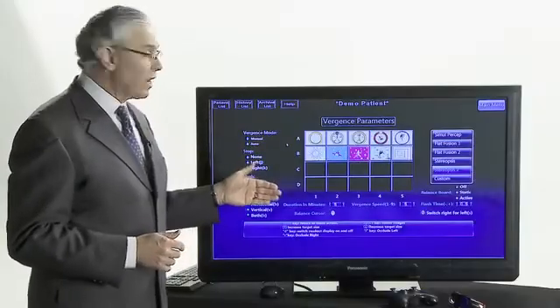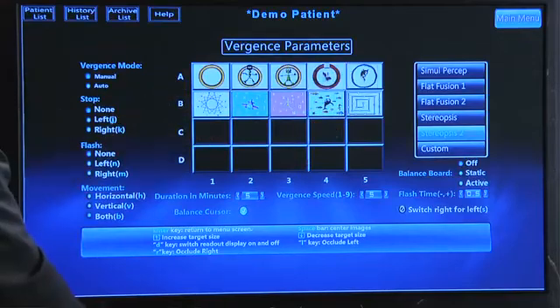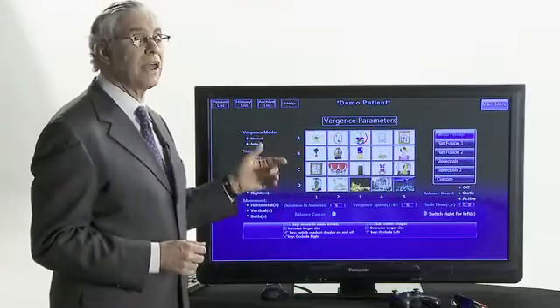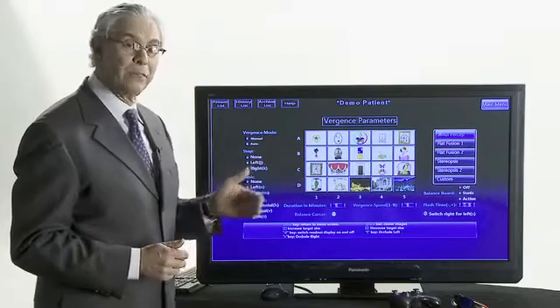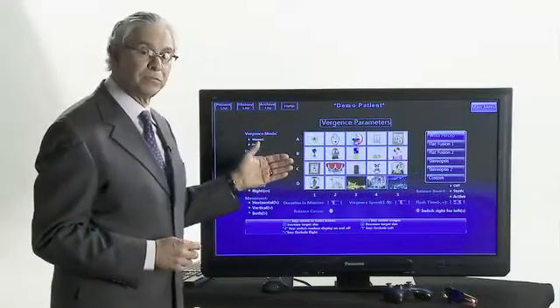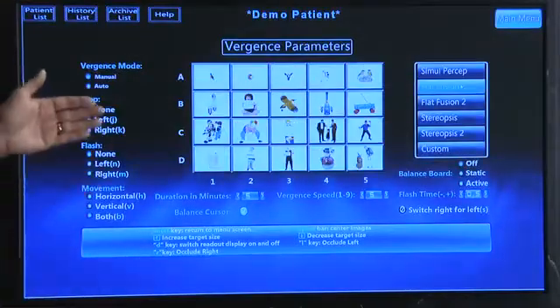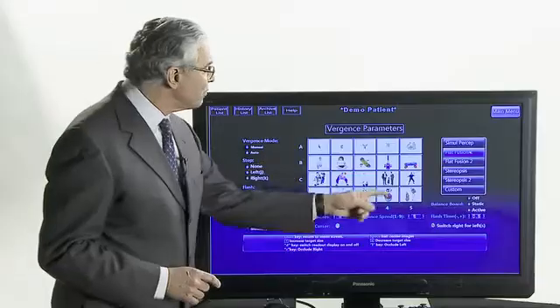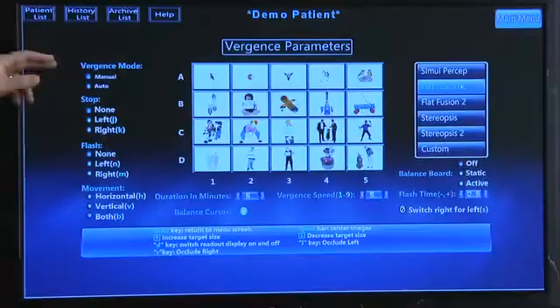Within each therapeutic regimen, we have a host of targets broken down by their characteristics. Simultaneous perception means that each eye sees a different right eye and left eye view, wonderful in measuring subjective and objective angle, also important in breaking suppression in patients who have intermittent exotropia. Various flat fusion targets: we can change both the size and the size of the suppression area.